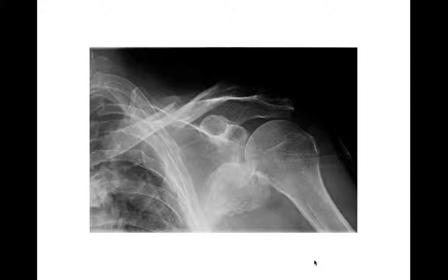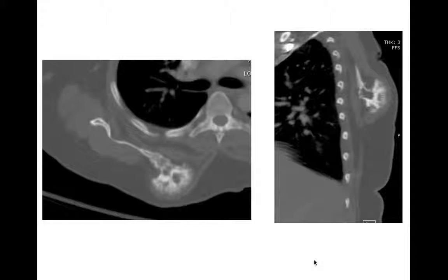Chondrosarcomas are the lesions that can occur off the scapula and are not uncommon. Again, remember METs, multiple myeloma, plasmacytoma, and osteochondromas are another lesion that can occur off the scapula. This was an osteochondroma. This is a pedunculated osteochondroma arising from the scapula here.